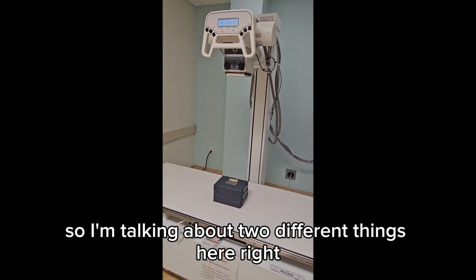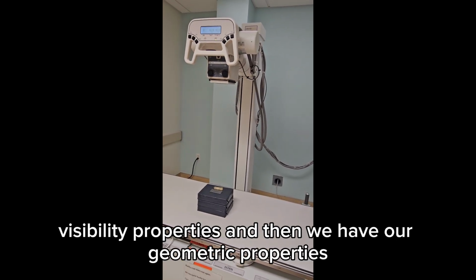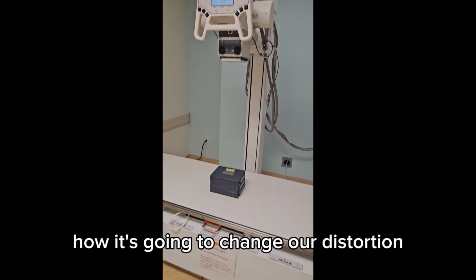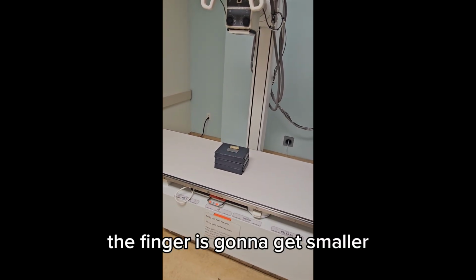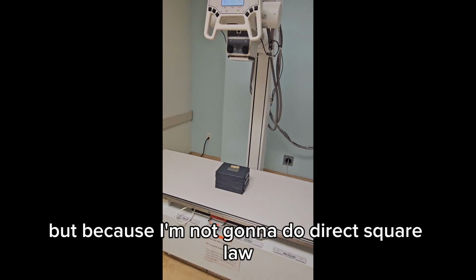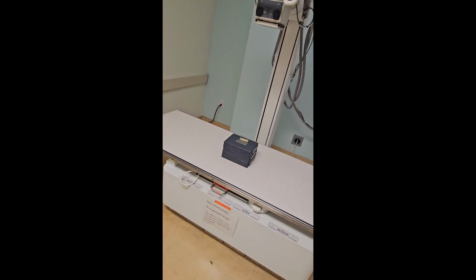So I'm talking about two different things here, right? We've got IR exposure and contrast, our photographic properties, visibility properties, and then we have our geometric properties, our spatial resolution and our distortion. And we need to talk about adding SID, how it's going to change our distortion. So we said that by adding SID, the finger is going to get smaller. It's not going to be as magnified. Spatial resolution should go up a little bit. But because I'm not going to do direct square law, this increase of SID is going to cause me to drop IR exposure. Contrast will not change, okay?